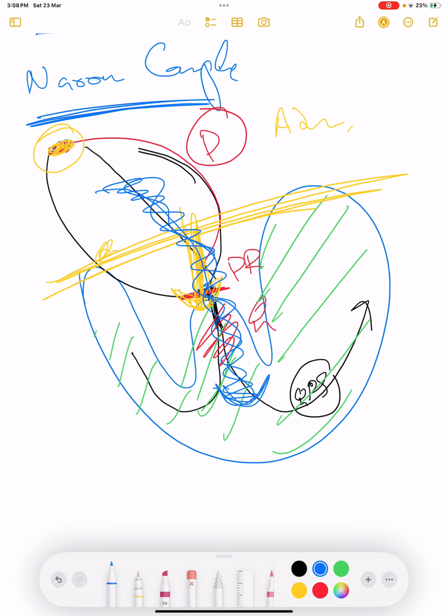Okay, if any conduction is not following this path, or some conduction is happening from this side, or there is a focus in the ventricle and conduction is due to this focus, there are some impulses being conducted, and that will lead to an abnormal QRS complex, which in other terms will be a broad QRS complex.